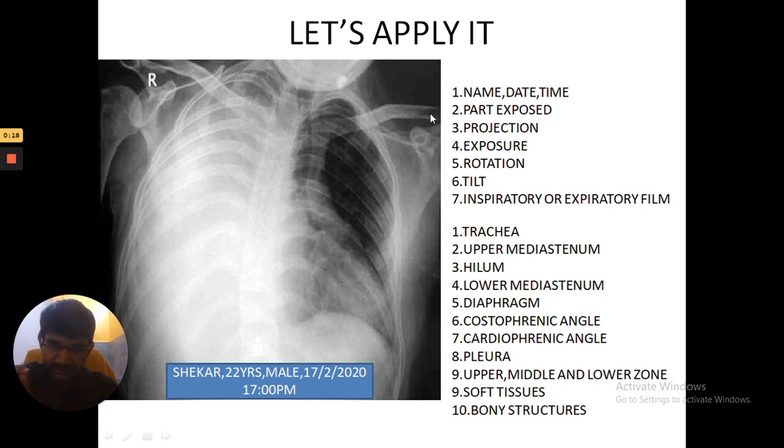An important catchy point you can see here: there are deposits in the clavicle. There is a deposit even in the humerus. These are the catchy points. It could be metastasis. So the differential diagnosis is right-sided pleural effusion, or it could be a mass with suspected malignancy.